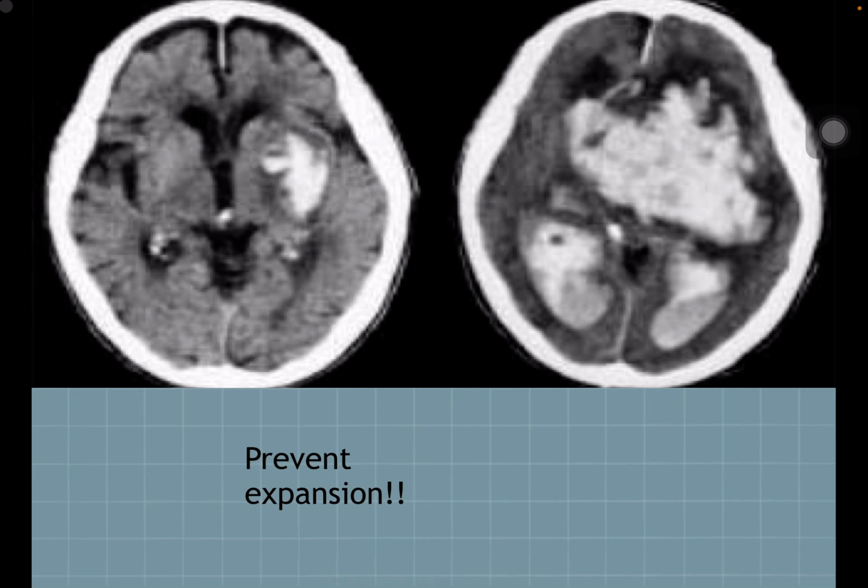Okay, this is a case of an 82-year-old male hypertensive smoker presented with a severe headache and right side hemiparesis. The initial CT brain was done here. It revealed an intracerebral hemorrhage at the left basal ganglia, and then abruptly the patient deteriorated and went into coma approximately 3 hours after the first CT.